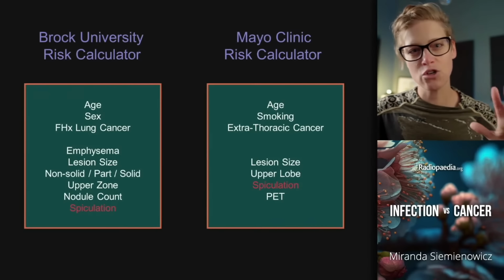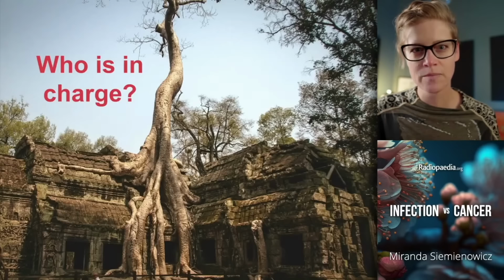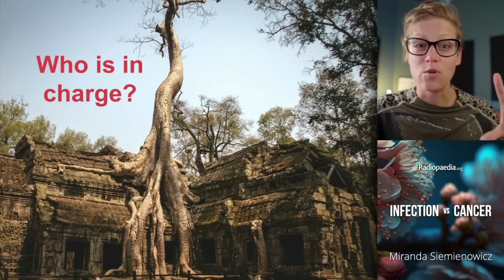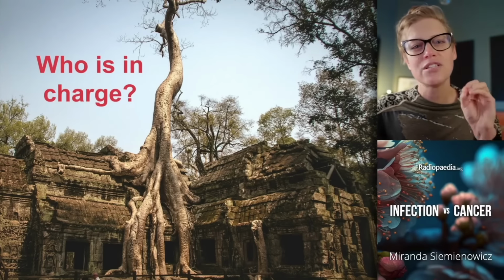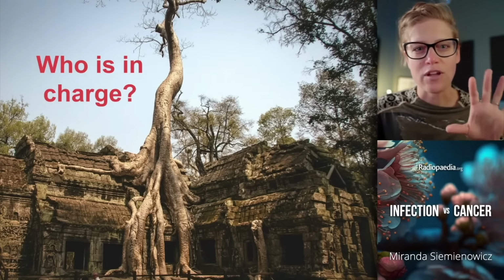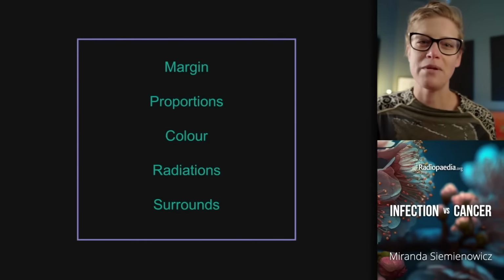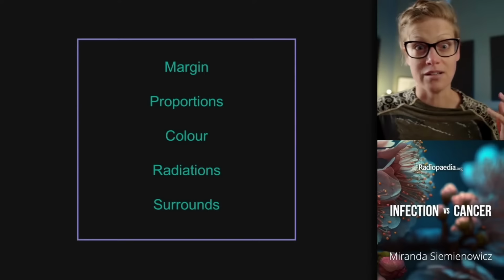We do that when interpreting these cases by asking over and over again in different ways one fundamental question: who is in charge? Is there a process that is superimposed on the normal background lung parenchymal architecture, which remains recognizable and visible despite the presence of the lesion? Or does the lesion itself drive the local structure with distortion and destruction of parenchymal architecture? The features that we look at are the lesion margin, lesion proportions, the color, by which I mean the appearance on post-contrast imaging, any radiations emanating from the lesion, and an analysis of the lung surrounds.